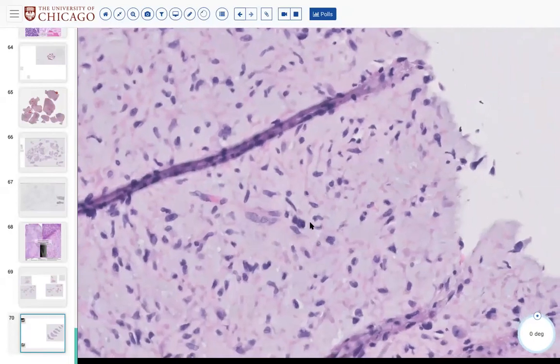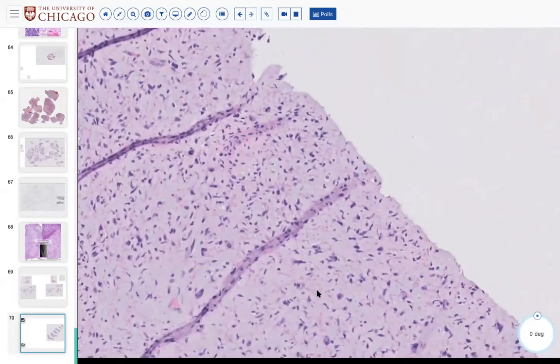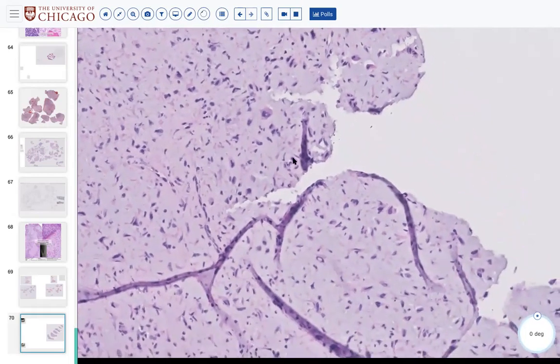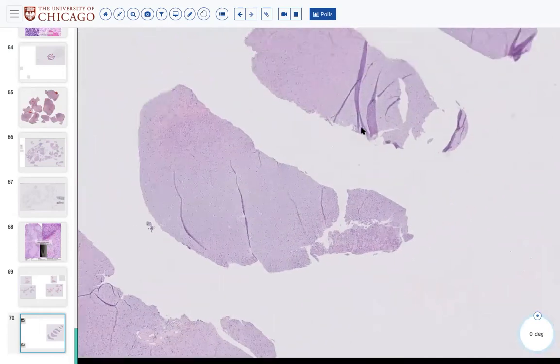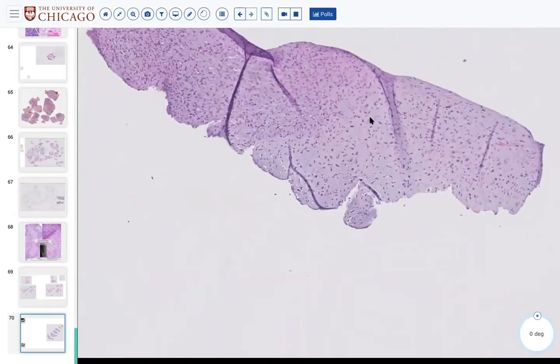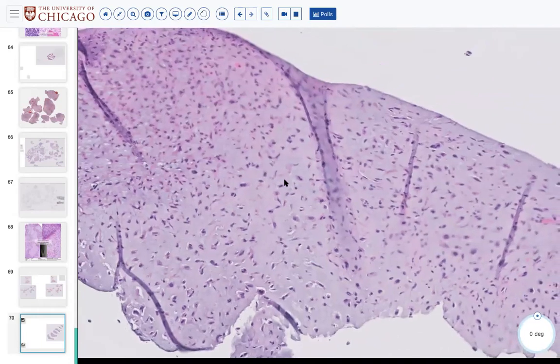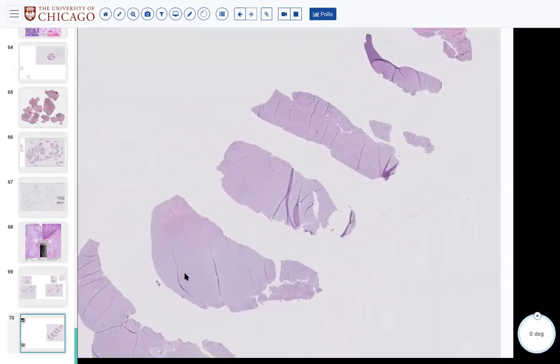Arguably, the hyperchromasia is a little bit smudgy. Certainly there are a few mitoses or no mitoses, but this was a very challenging case. So always keep in mind some kind of pseudo-malignant change. We were cautious on the frozen, and after multiple iterations, this turns out, we think, to be a benign lesion. So that's that. I certainly learned from this case.